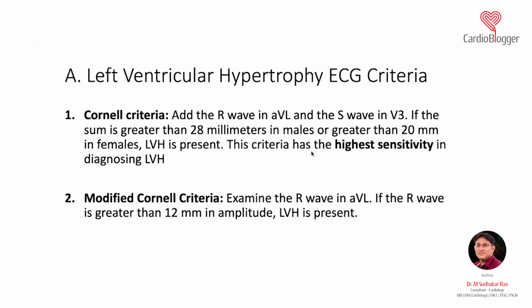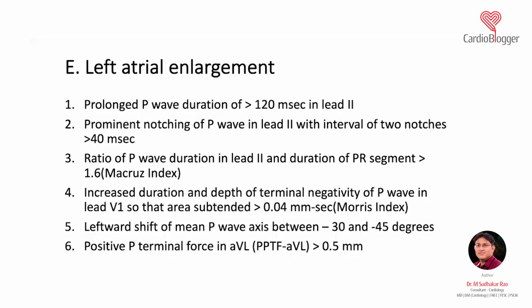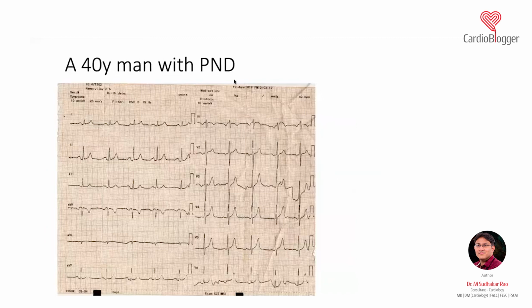However, like the other ECG which I showed you, if you have an isolated negative deflection in V1 and the terminal deflection is more, it means there is a left atrial enlargement. However, if you have both positive and negative deflection like this, the negative can be because of the right atrium or the left atrium.